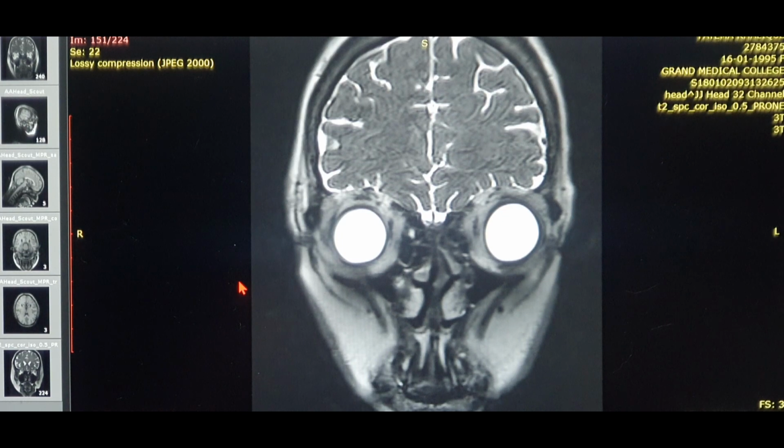Now there are two different types of MR cisternography. This is normal MR cisternography without the contrast, where you just make the patient lie in supine position, or you can say the prone position, basically the prone position, so that the pressure increases in the intracranial cavity and the CSF may have a leak, and that leak can be detected on the MR cisternography.